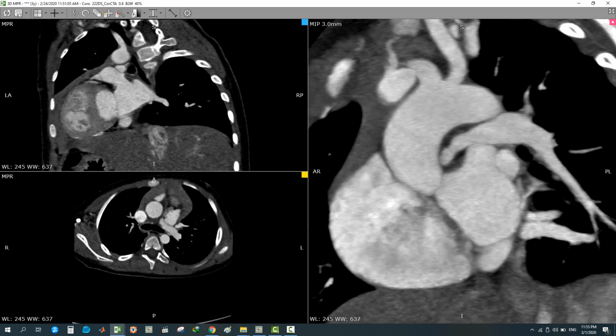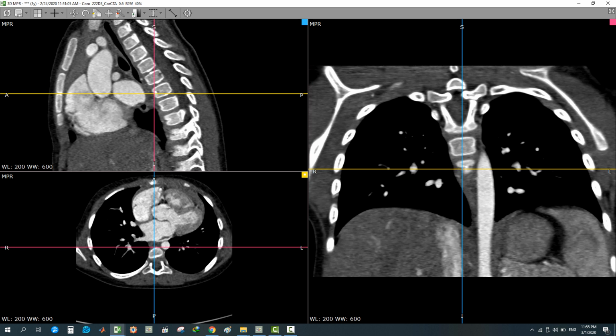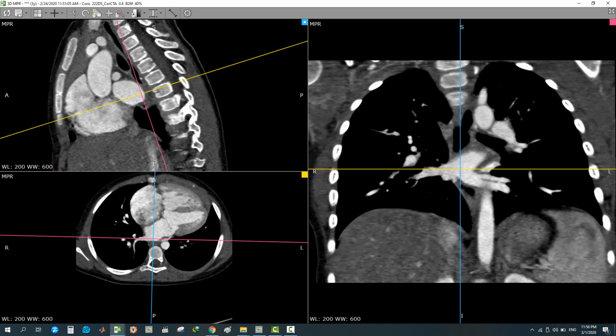Okay. After that, I want to show the pulmonary veins. As this case shows no anomalous pulmonary veins drainage. In the axial, bring your crisscross lines here to intersect two pulmonary veins, one in the right and one in the left, in this way. Slight cranial or anterior inclination, as you see, this one.